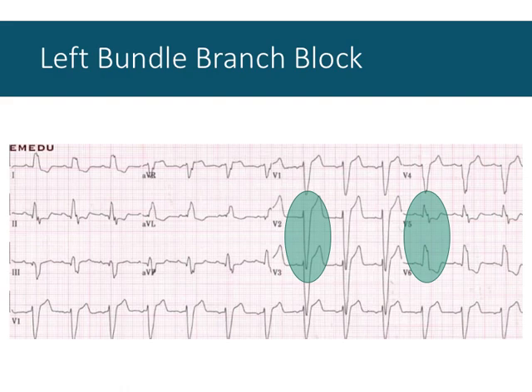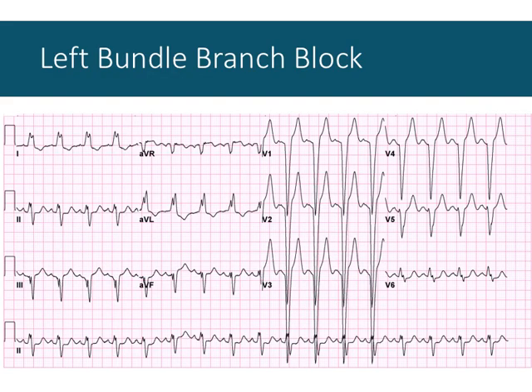And this looks fairly large, but it's not even that exaggerated. I'll show you another example of left bundle branch block. We still see the notch over here in V6, not very much in V5 to be honest, and massive negative deflection in V2, as there's a pretty severe bundle branch block and the lateral wall depolarizes last. So positive wave away from a positive electrode gives a massive negative deflection.